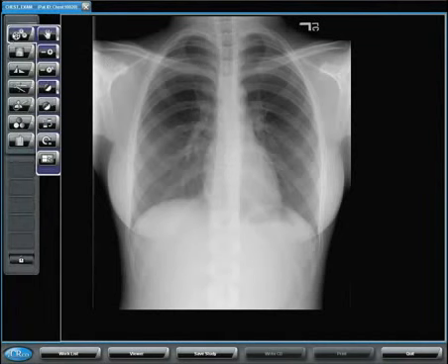We have numerous tools to choose from, and the users are able to customize their mouse to map out the mouse functions, the mouse keys, to the particular tool. So let's start with the pan tool. Also, by default, your system will always open with pan being the left mouse button, window and level being the right mouse button, and zoom being the center scroll wheel.